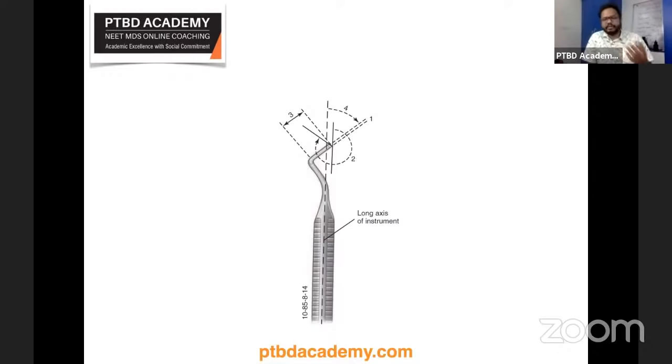Take for example a straight chisel, 12, 7, 14. If the edge, or the primary cutting edge, is perpendicular to the blade, then we omit the primary cutting edge angle, as it is obvious. So if the edge is locally perpendicular to the blade, this number is normally omitted, resulting in a 3-number code, just as we discussed now.